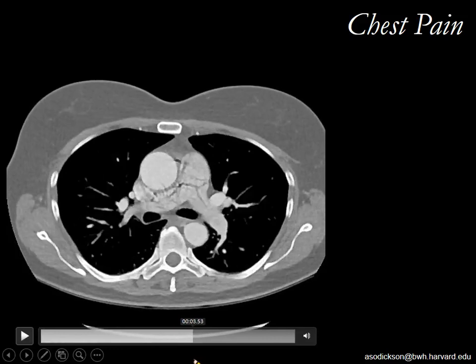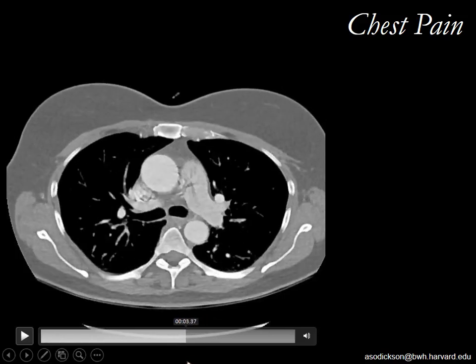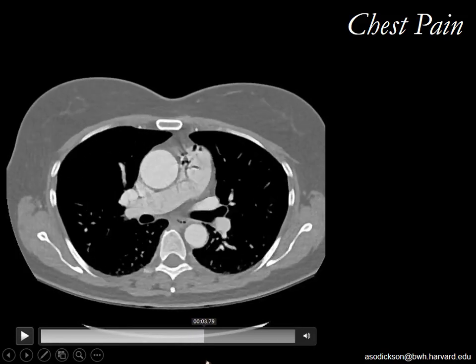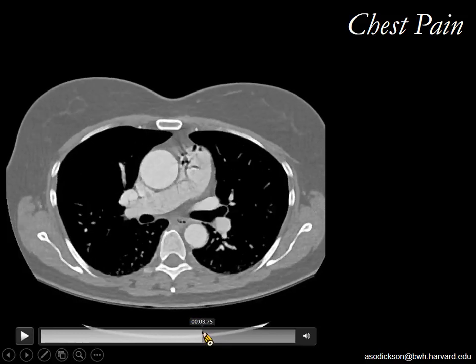This is not terribly common to see this much gas. We'll sometimes see small amounts, but the reason I wanted to show you this is just to see what happens when we have gas in there so that you can recognize this if it happens. Because this causes some confusion sometimes for people with this very funny curvilinear appearance of these things. People start to question, how could this possibly be gas?